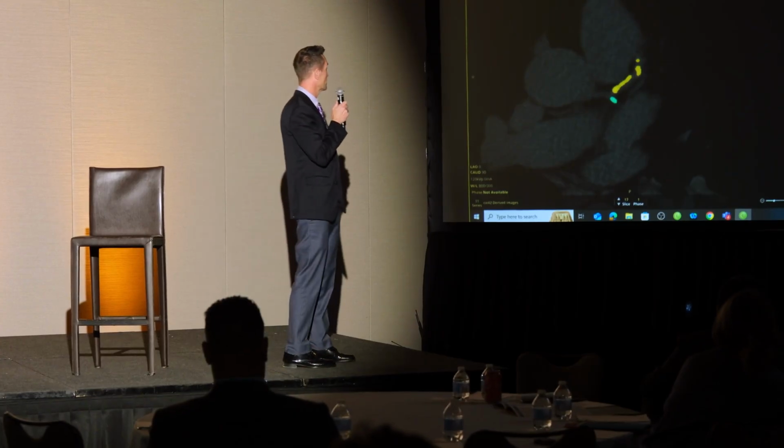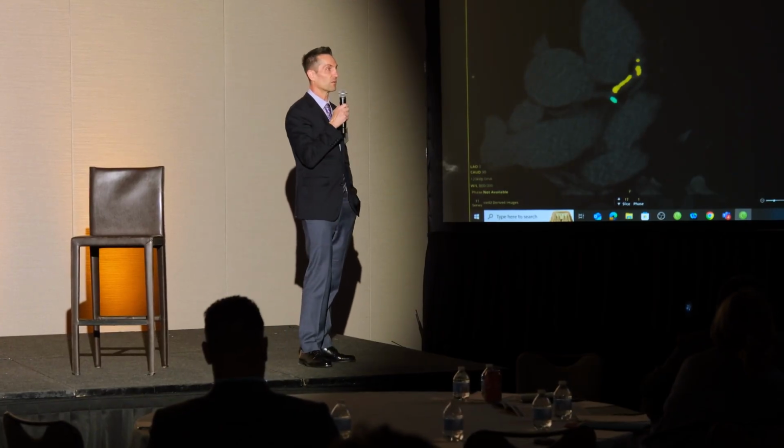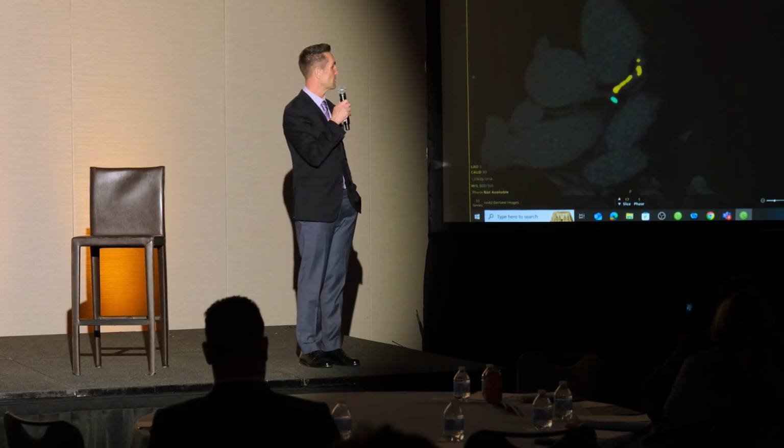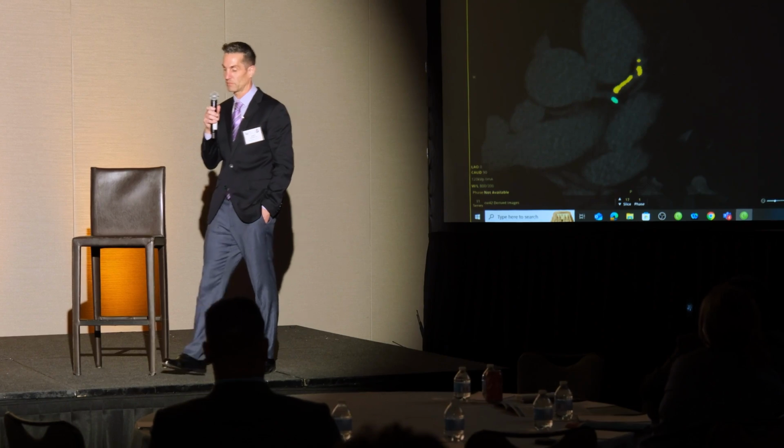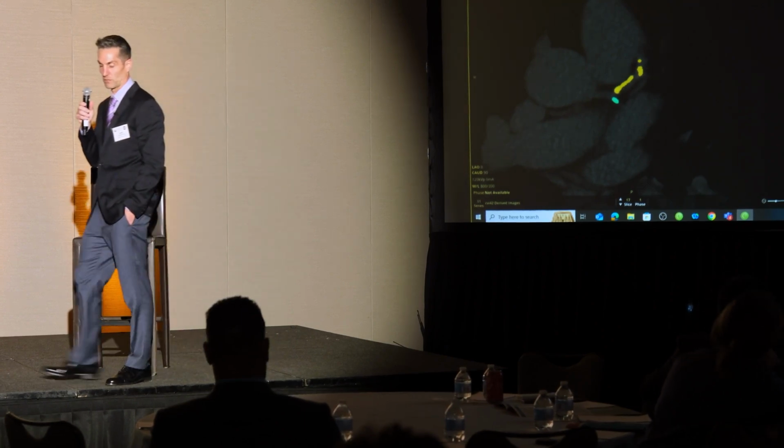So the quickness and the accuracy with which this is done is all 1- and 2-click applications.